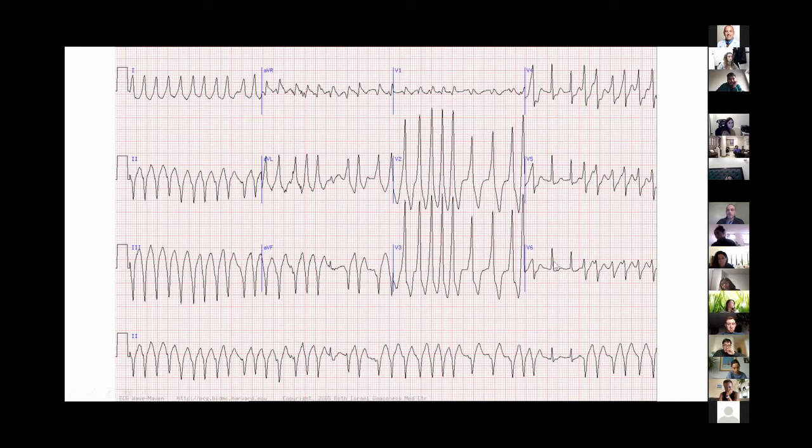So these narrow beats that you pointed out are probably conduction through the AV node. And that's how this EKG would look if it were just AFib with narrow QRS complexes. In certain situations, the AV node is fully blocked and you have full conduction through the accessory pathway. And in those moments, the delta waves would be most visible.